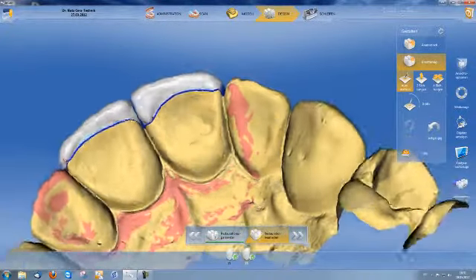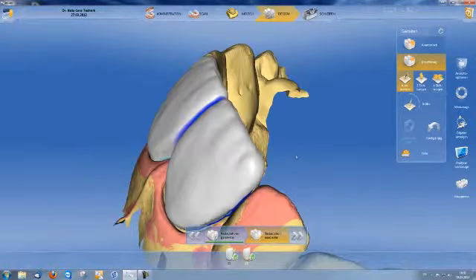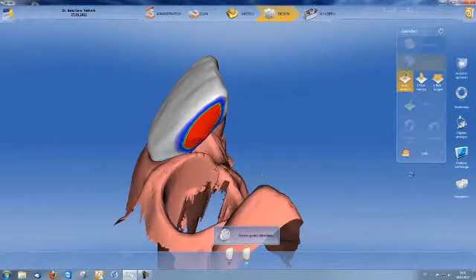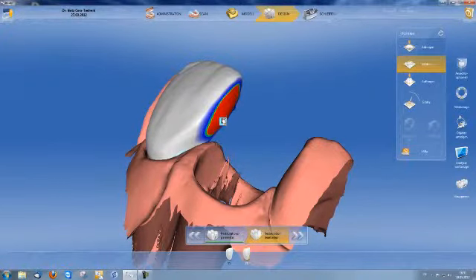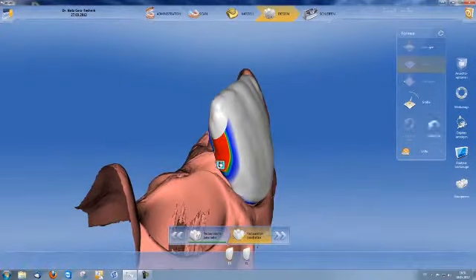I now check my proximal contacts as I determined the anatomy beforehand on the wax-up. I trim the model, deactivate grouping, and do this using my smoothing tool, both on tooth 21 and 11 to achieve an even and flat proximal contact.